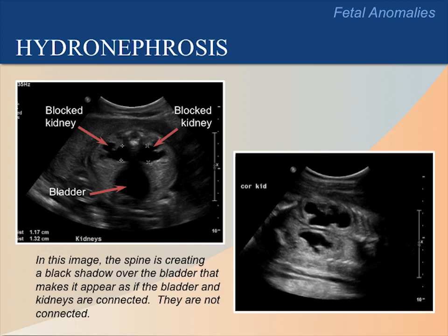What do you see in the lower right image? Note that this is not a transverse image of the fetus. It is a coronal section, which divides the body into a front and back half. Please pause the video now to encourage responses.